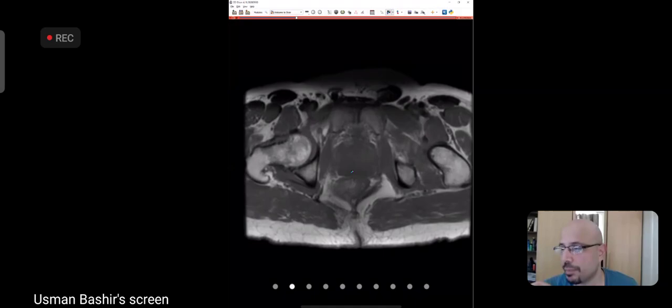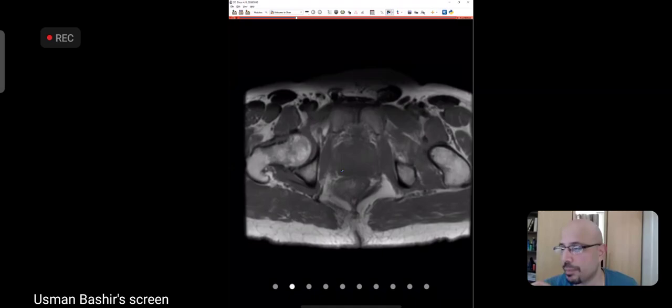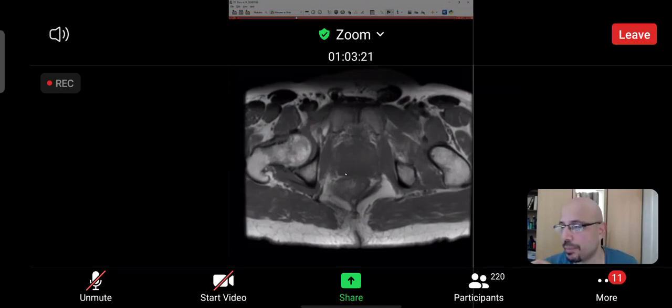Your blood products are going to give you a dark signal on diffusion imaging, and you're going to think it's a PIRADS 4. So if you did not look at a T1 weighted sequence and you call it PIRADS 4, you later pointed out that was actually just hemorrhage. That's why, in this guy's T1 weighted.